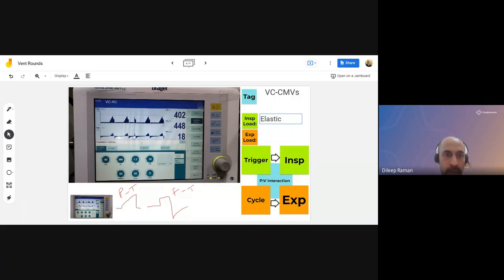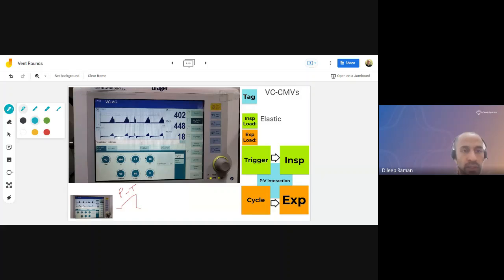So let's go to what Mani Balaji is trying to say. He's saying that in this part, the part where exhalation is happening, it's not reaching the baseline, right? So for example, if you get a waveform, how it should look in exhalation is that the normal expiratory waveform, if you're going to draw it, it should look something like this. So you have your baseline, there should be a flow going up, coming to exhalation, and then there should be a decay like this. On this, what we are seeing is a little bit different.